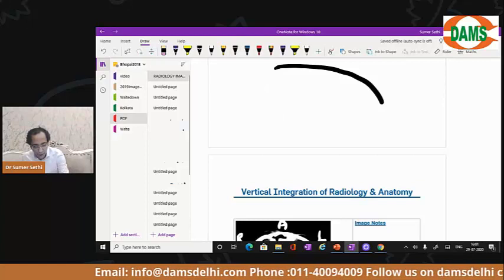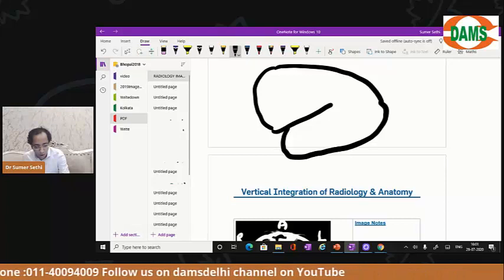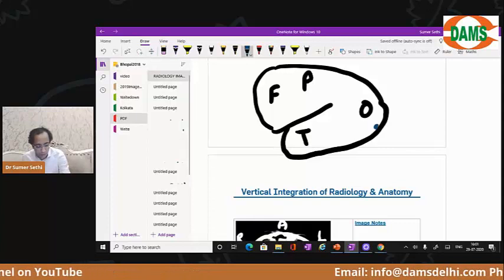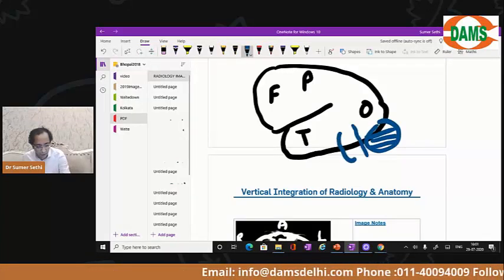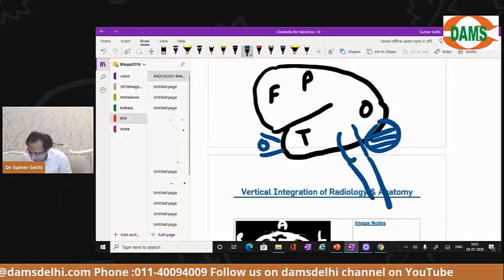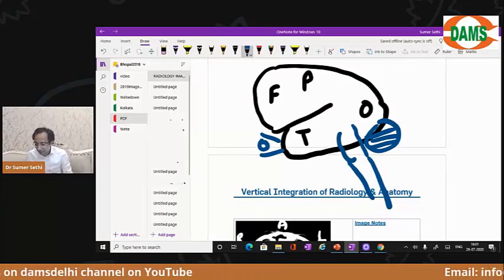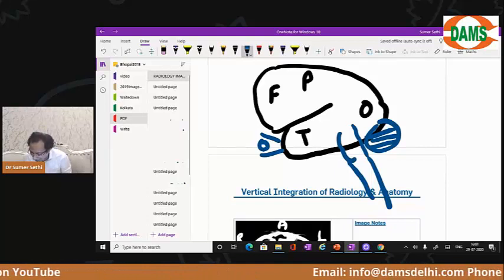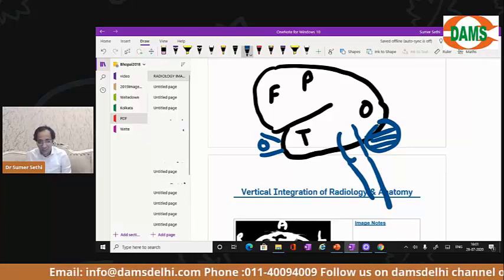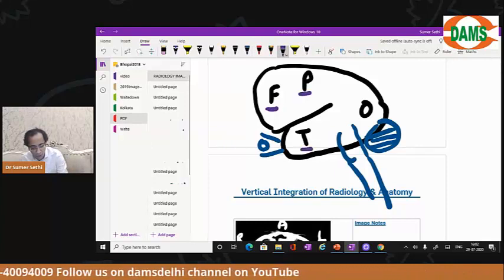बच्चे देखो, if this is your brain, this is what I was trying to teach you. So this is frontal lobe, parietal lobe, temporal lobe, occipital lobe. Below the occipital lobe, you have cerebellum, then you have the pons, you have the brainstem. This is where you have your orbit. Okay. I know, that was a very heavy software, so it kind of lags. But I just wanted you to have a feel of how the brain really looks. So please start. If you type a little bit less, it will be better to understand. So you have frontal lobe, parietal lobe on the top, temporal lobe at the bottom, and like this.